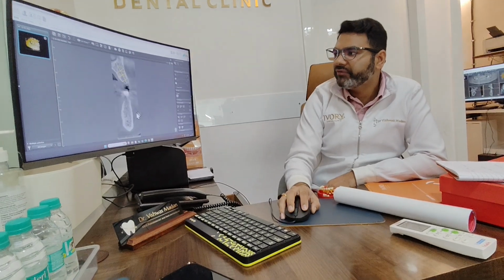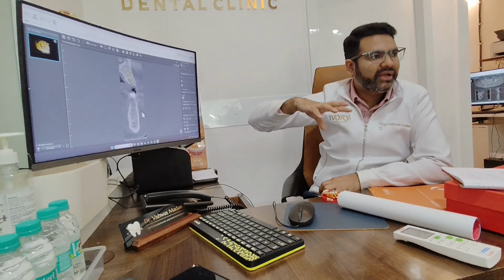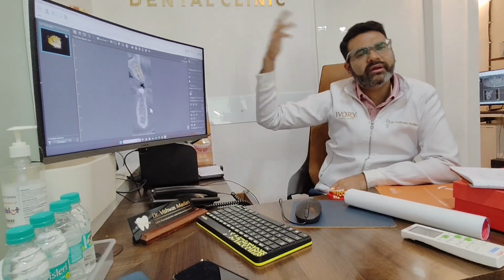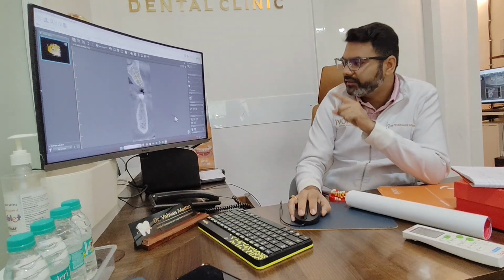And then we also have 24 mm, but we don't need to place 24 mm. We can go by 4 mm, or let's say in Norris we have 4.2. So we can go by 4.2 by 10 or anything, or 13 or 16, whatever we have. Okay, so we can actually plan the implant here.